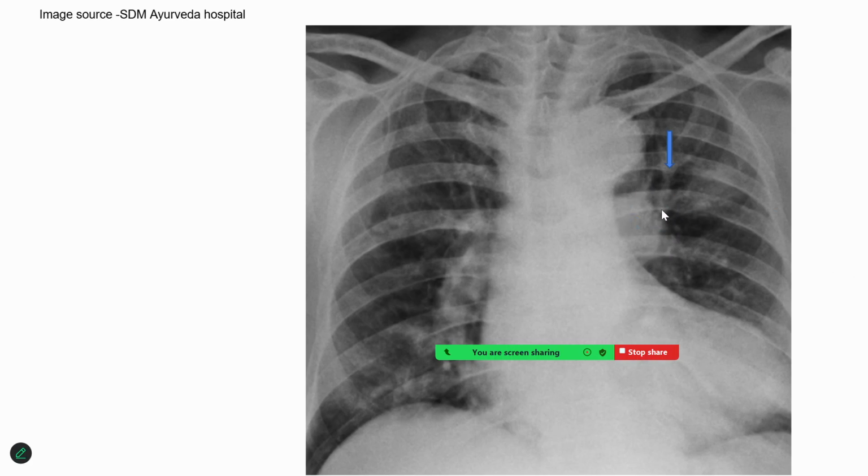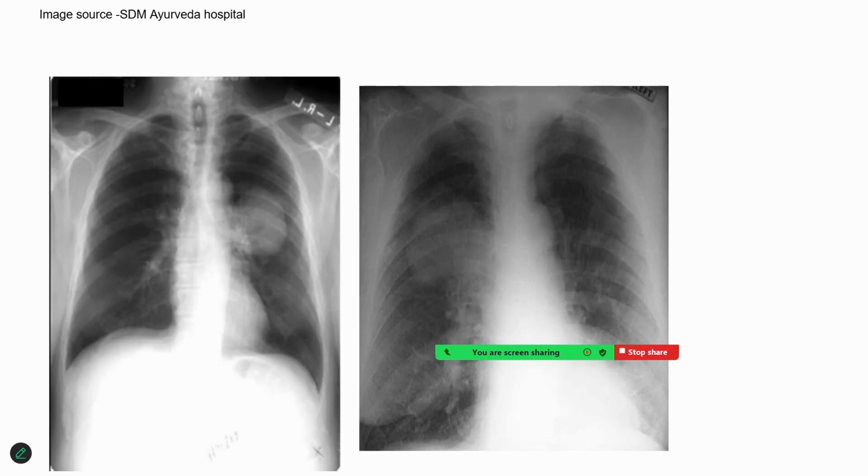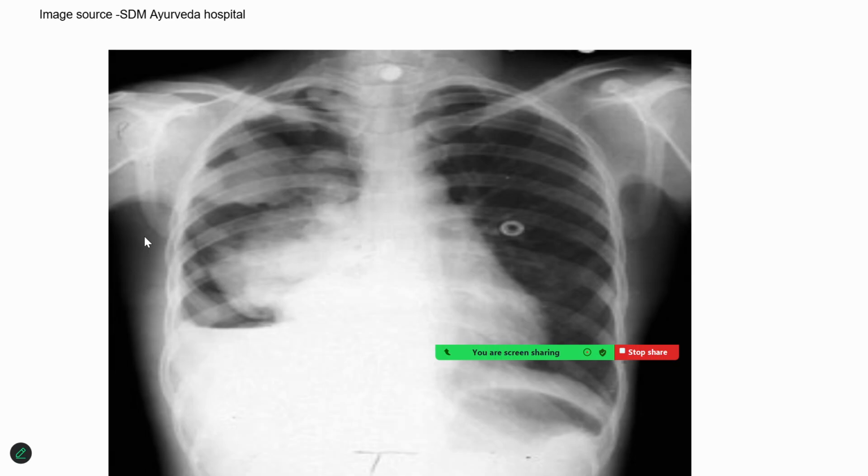A very huge nodule in the hilar area with an irregular consistency is more typical of a tumor pathology. Again, the exact type of tumor, whether it is a lymphoid tumor, needs more elaborate clinical assessment, as lymphomas can also present with a similar appearance. A typical squamous cell carcinoma, which presents with a huge ball-like appearance with dense opacity, is very classical of tumor pathologies of the lungs. So, a diagnosis of lung cancer is made.